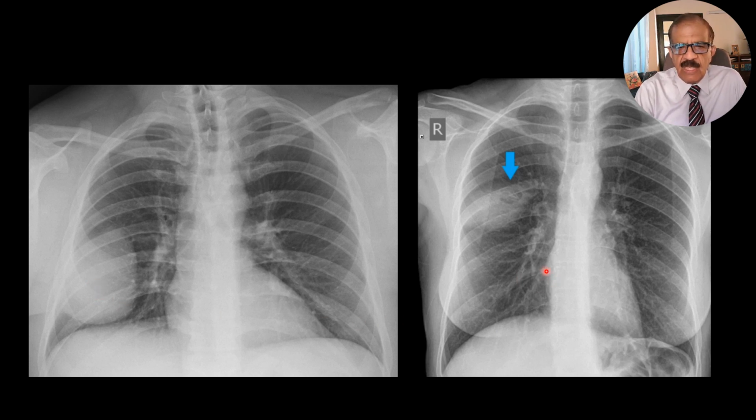This is the other side, the other person, and you can see that this is another person from the breast shadow. This is a woman, and this is an opacity here. It is probably encysted effusion in the transverse fissure.